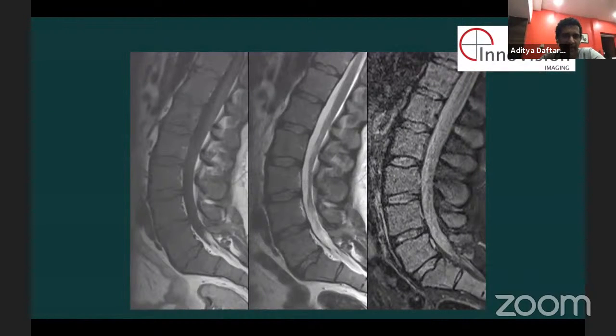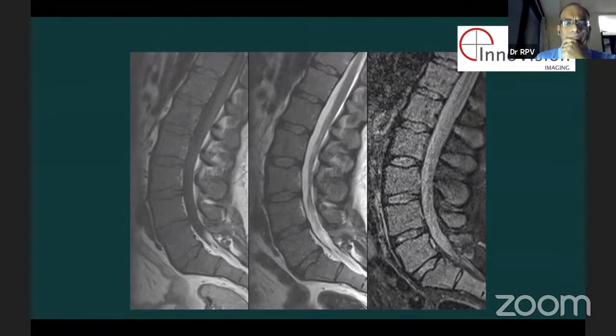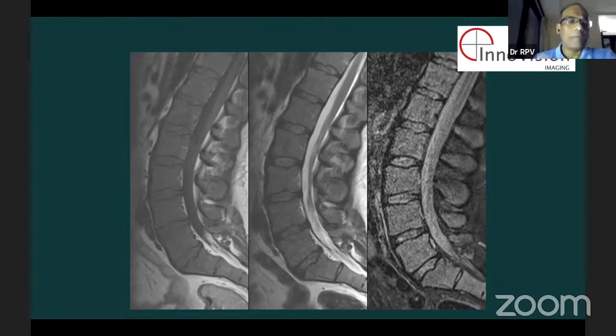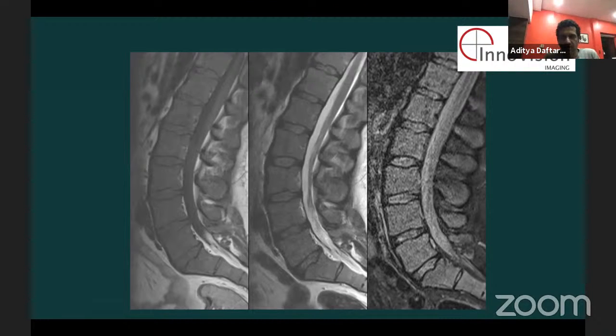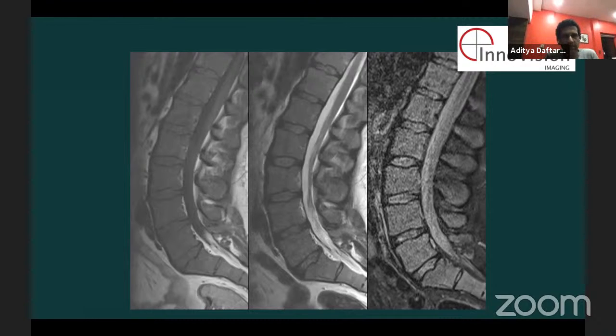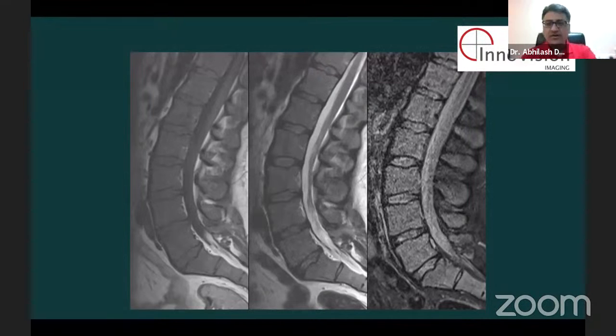Okay. So given that, who can I call on? Amay or Shubhanshu, one of y'all? Amay, you're around? Hello. Yes, sir. Okay, I'm going to go ahead. Go ahead. Tell me what you see on this spine MRI. Hello, can you hear me? We can hear you, Amay. Go ahead. Can you see the images? Yes, sir.